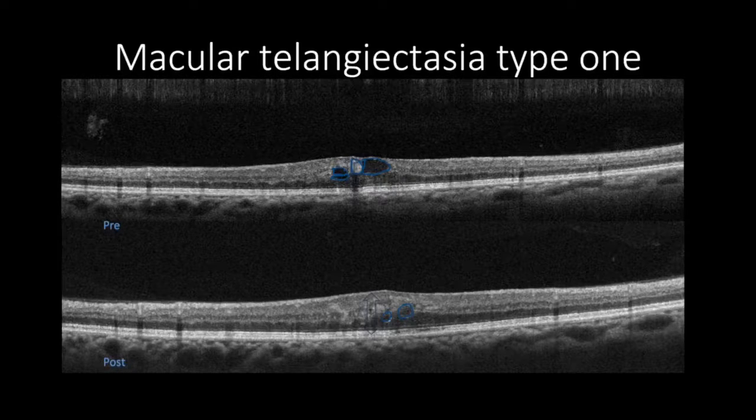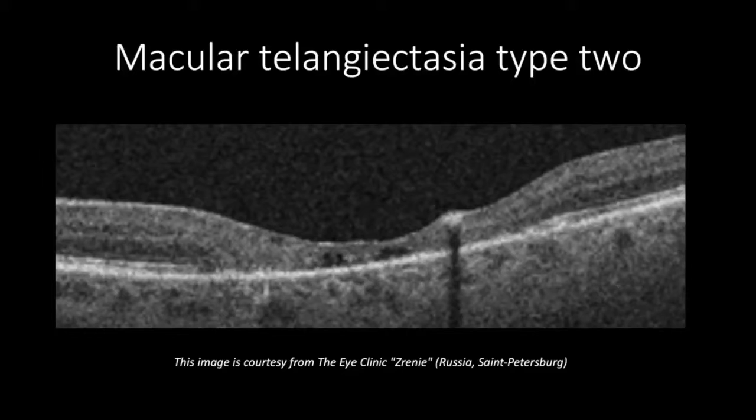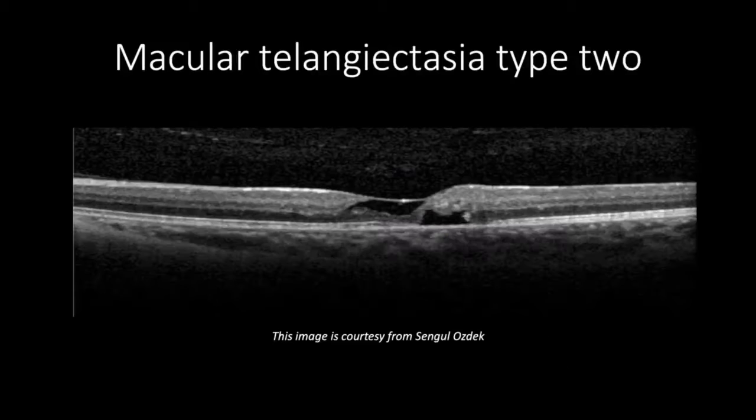However, in macular telangiectasia type 2, OCT may show in early stages an enlarged temporal foveal pit, but as disease progresses, it may show degenerative changes such as cavitation. Intraretinal pigmentation will appear as hyperreflective mass, which casts a shadow artifact, and as disease progresses, the cavitation will involve inner and outer retinal layers without any increase in retinal thickening.